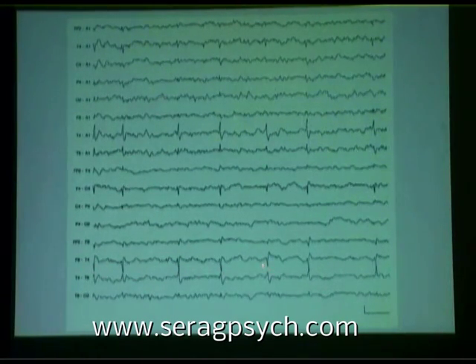This, by the way, looks like a temporal spike, and it is in this little section here. But if you see this, you know it's not an anterior temporal spike, because anterior temporal spikes are seen prominently in FP2 to F8, because F8 gets very heavily involved, and there's usually some cancellation between F8 and T4, and then T4 deflects very prominently with the relatively uninvolved T6.